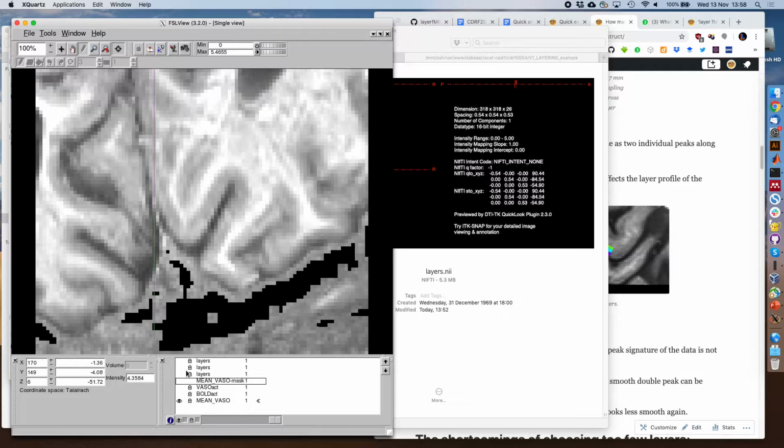It's a question of whether I want to do the stuff which Kamil said. If I'm not going to do it, then it's perfect. But if I want to do that, then I need the layering. Which I want. I also don't want to regress everything in a separate step. I want to do everything in one step because that's what fMRI people do nowadays. So that's why I will try it and see whether it makes a difference. Sure, yeah, do it.